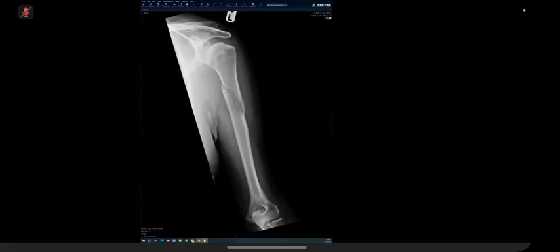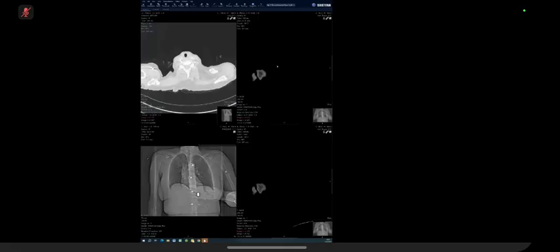So when you said this could be a metastatic deposit or it could be primary bone, are these your two differentials, bone tumor or metastatic tumor? Yes. This could be the primary, because it could be a primary bone malignancy. So if this was a met, what do you need to request before you go down the biopsy route? I would do a CT thorax abdomen pelvis to evaluate for the primary.